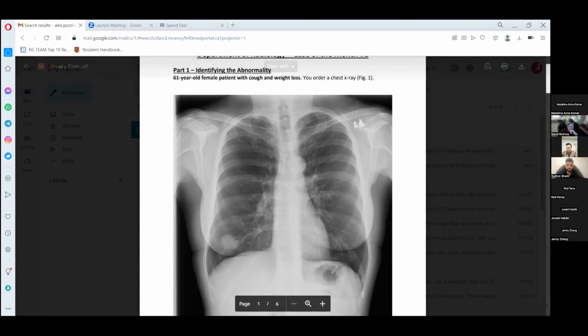And that will indicate that there is air inside the abdomen, and that can indicate some serious pathology like a perforation or some other acute abdominal problem. And also sometimes you can notice some things on the visualized abdomen, like maybe dilated bowel loops that will prompt you to look closer into an abdominal x-ray and perhaps investigate a potential bowel obstruction.